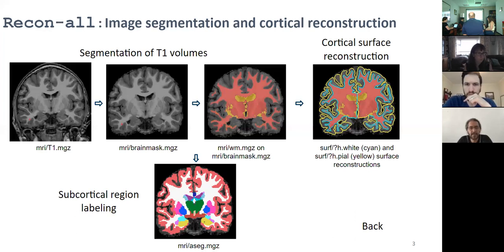And there are a few things that we don't do that can improve the results. So we go in, we get a T1. Over the last few versions of FreeSurfer, they've built in the ability to combine T1 images with T2 images. Oh, nice. And that does a better job of skull stripping and can result in better pial surfaces.